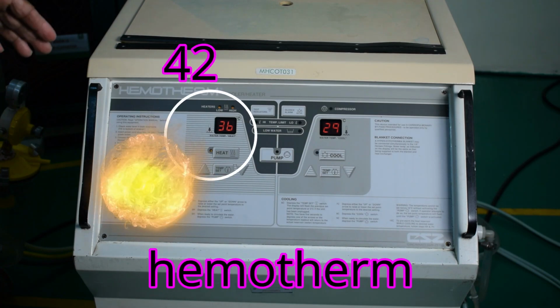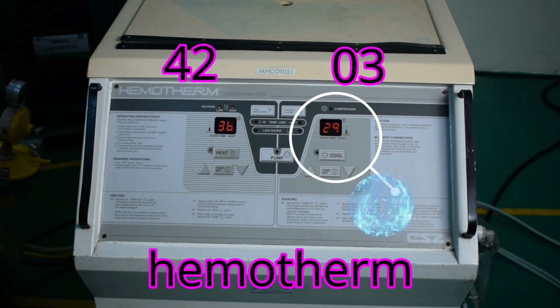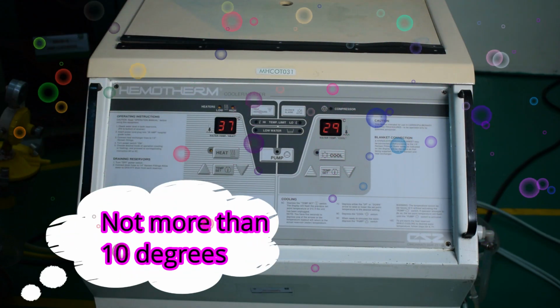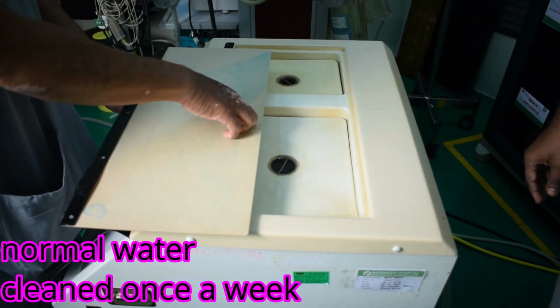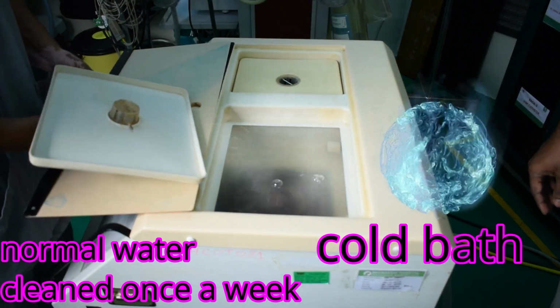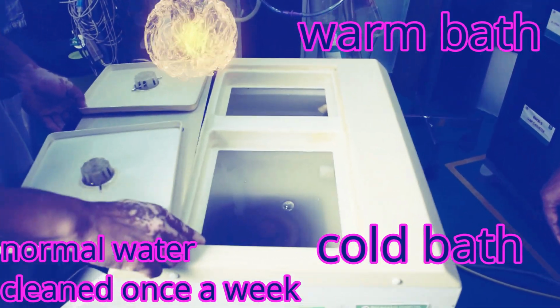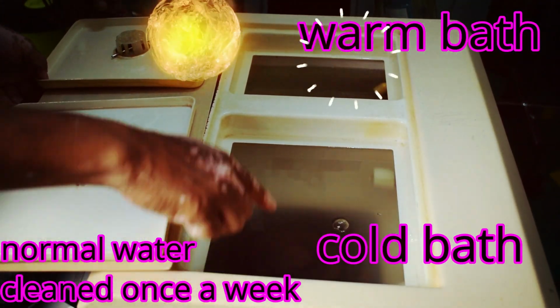To prevent formation of gaseous microemboli, the temperature gradient between the water and the blood does not exceed more than 10 degrees centigrade. Generally, the heat transfer into and out of the heat exchanger is provided by non-sterile water that is circulated through a heater or a cooler unit, which is part of the perfusion apparatus. Now, when cooling is desired, the water is passed through an ice bath, and when warming is desired, it is heated by electric heaters.